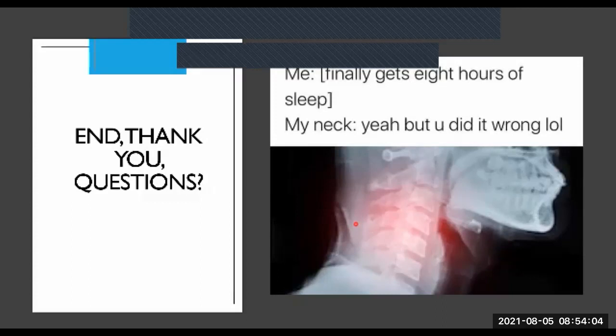But when you looked at him, he's sitting over there, he's breathing fine. So they did the x-ray. Luckily, somebody did the x-ray. When we had a look at the x-ray, and you'll see it on there, there are all these streaks of gas, because quite simply the trachea had cracked open, right? And when you touch, you can feel that surgical emphysema underneath. Everything was happening. So I'll post that video again. This patient ended up going to Grace, having quite extensive surgery, unfortunately, to repair the trachea. So it just shows you the importance of looking at this.